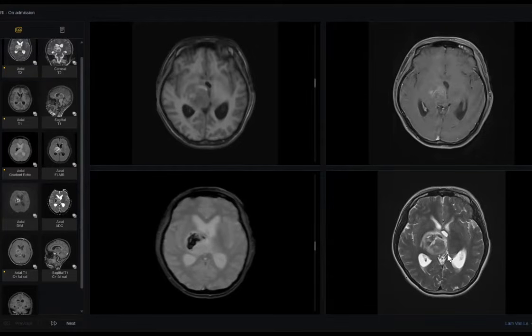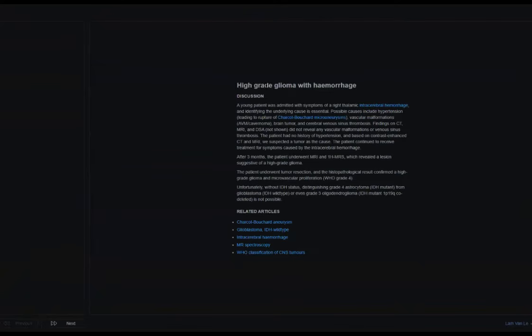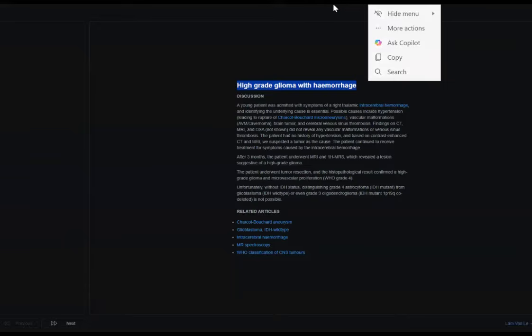Please have a look around the lesion and above and below it. Why? Because finally, it is a very big disaster. What is this? High-grade glioma, and almost the patient will not still be alive. A very dangerous diagnosis.